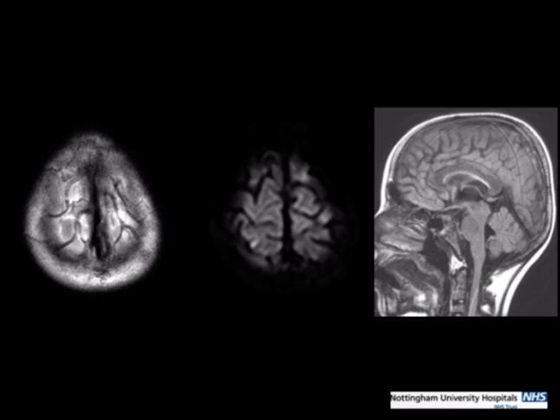And as Mary was saying, MR and venous sinus thrombosis is a bit of a nightmare. Oh look, there's a nice normal flow void on the T2. There's no abnormal signal on the diffusion weighted imaging. Even the FLAIR's got a nice normal flow void. But hang on a minute, he's had contrast.